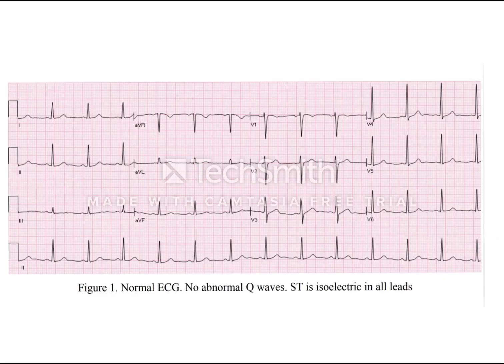Next, we'll talk about the bundle branch block. In pediatric cardiology, we use the same patterns to evaluate for conduction delays from surgery or for hypertrophy, or both. Suffice to say that you are first looking for a prolonged QRS complex in V1 and V6. If the QRS complex is prolonged for age and there are late positive forces in V1, that would suggest late right-sided forces and hence a right bundle branch block.